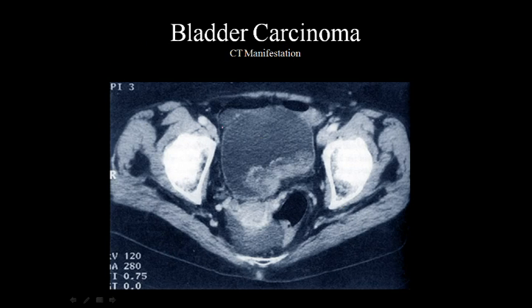Here's an excellent example. We don't really have bladder wall thickening. The bladder wall is this white area here, and we see it coming around. And so this area can all be said to be the urinary bladder. The interesting thing is we don't actually have the right phase for contrast enhancement, but we see that we have something here residing inside the bladder.